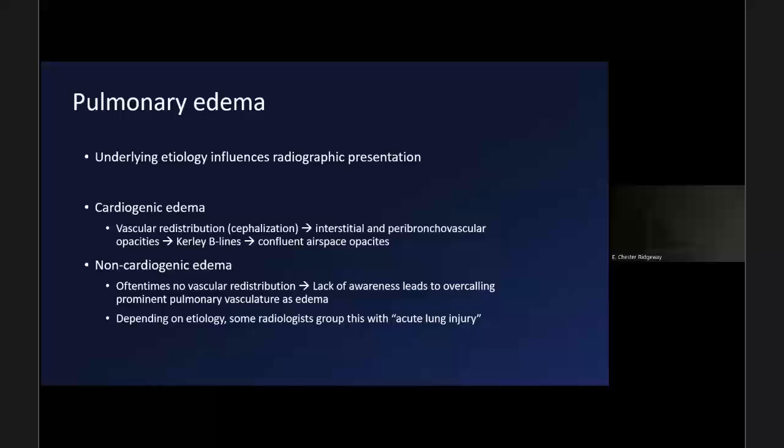All right, so moving past that, we're going to talk about pulmonary edema. This one can be a little tricky sometimes. There is variation even among radiologists as to whether or not we call edema, to what degree we call it.